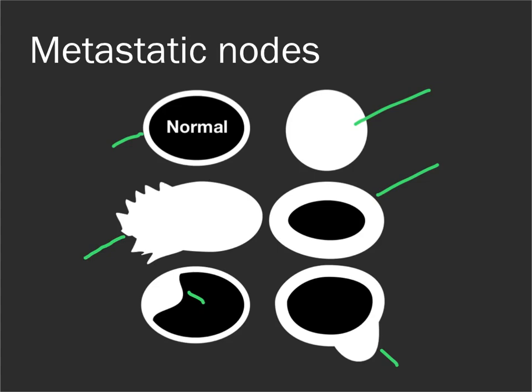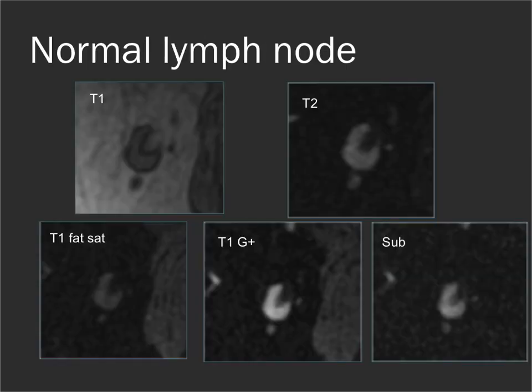The resolution of MR in the axilla is sometimes not good enough for us to really get good resolution of these nodules, and so we refer the patients to ultrasound for further evaluation, and some of them just turn out to be lobulations.